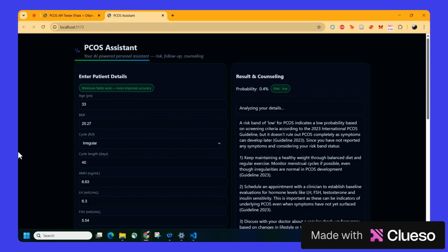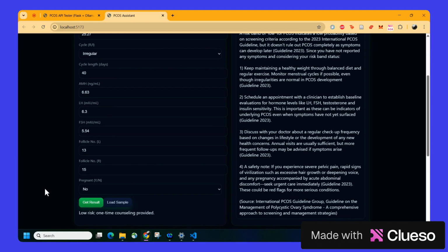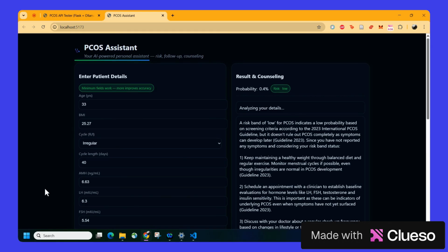This app could be made use of specifically by medical professionals, interns, medical students, but also by the patients themselves once they have the diagnosis and the reports of the doctor, so that various parameters could be fed here in the patient details. And now I'm going to be showing how to launch this app after having cloned my repository from GitHub.